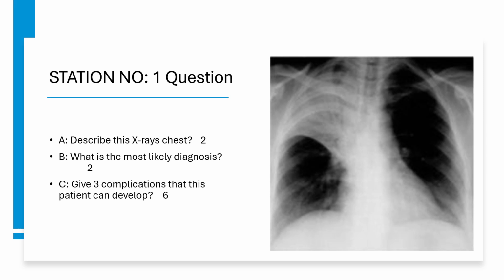On station number 1, we have a chest X-ray and there are 3 questions. Question A, describe this X-ray chest. Question B, what is the most likely diagnosis? And question C, give 3 complications that this patient can develop.